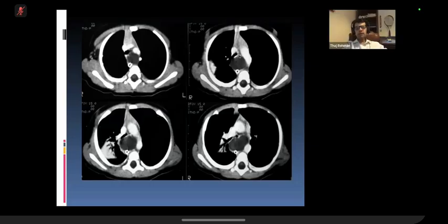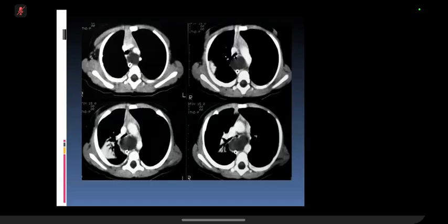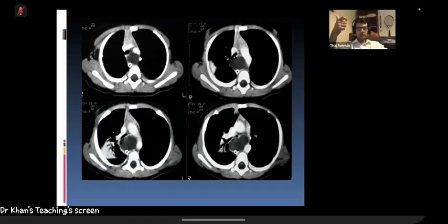Yeah. So this is middle mediastinum, and as we know, middle mediastinal differentials are quite few, which is either arising from the trachea or bronchus. In this case, like a bronchogenic cyst or a cancer arising from the trachea or bronchus, or lymph node or blood vessel structures. It's not blood vessel structures, it's not lymph node, so it's a bronchogenic cyst.